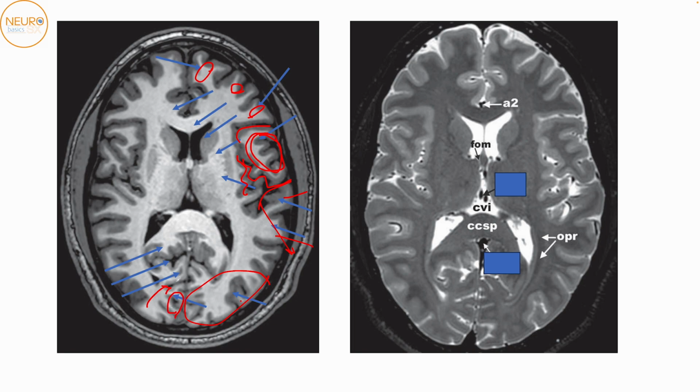In front of the calcarine sulcus, you will have the... So at this level, what happens is that the calcarine sulcus actually forms two stems. So these are two stems of the calcarine sulcus over here. So just to make this clear, one second. Yeah, so at this level, the calcarine sulcus has two stems.